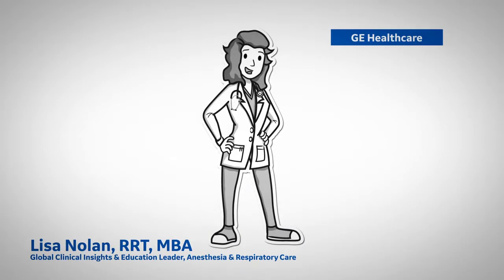Understanding low-flow anesthesia using end-tidal control on the Aisys CS2 anesthesia delivery system is as easy as that.